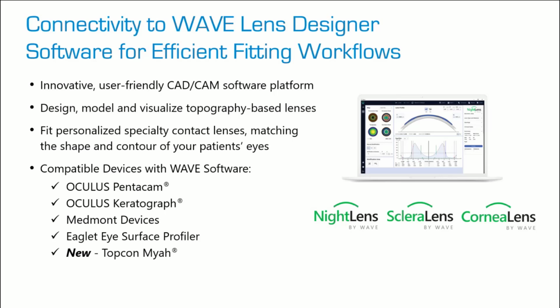Here's a brief overview of the Wave lens design software and its connectivity capabilities. The Wave lens software has been a leader in specialty contact lens design since 1999, and the software began with designing orthokeratology lenses. The platform is innovative, very user-friendly, computer-assisted design software that allows practitioners to design, model, and visualize topography and tomography-based lenses. Because we're using that data, each lens is personalized to match the specific shape and contour of the patient's eye, and that creates a really unique, custom, proprietary design.